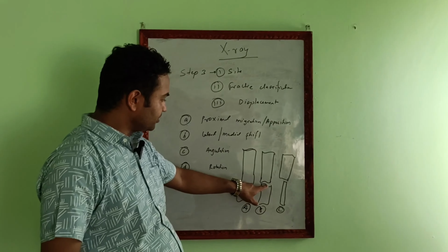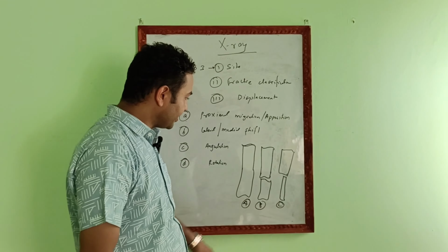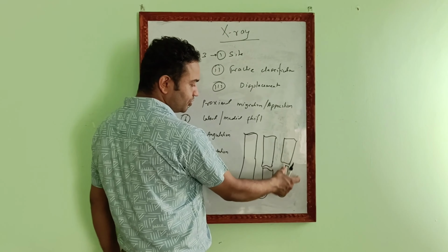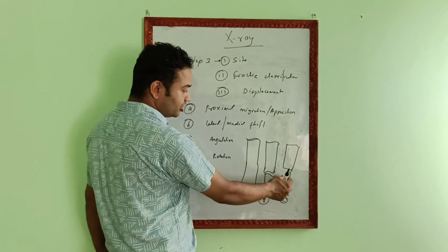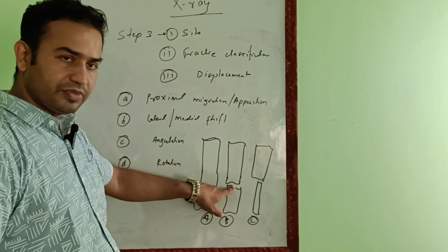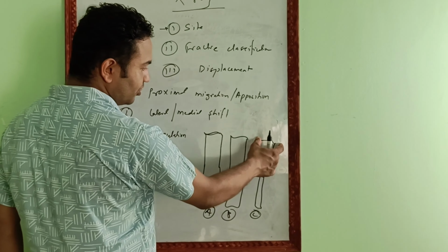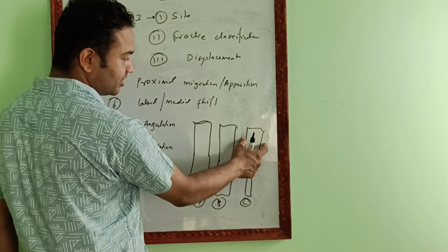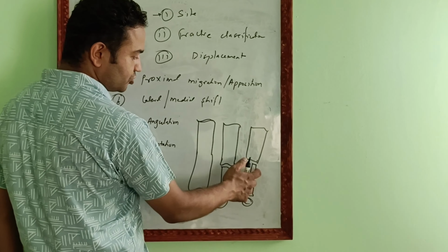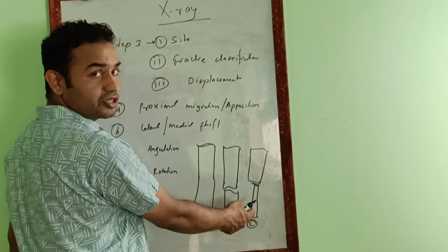Now suppose this is a bone, there is a fracture at the mid shaft of this region, and in fracture C, you find that this whole bone is thicker and this bone is thin. In the AP view of both the bones, with the same views, this bone is thinner than this one. So the distal fragment at the fracture site is not aligning with the proximal fragment. So some rotation is also there.